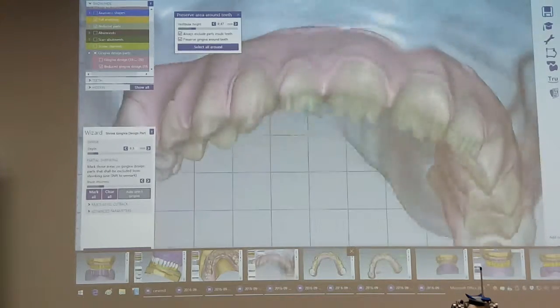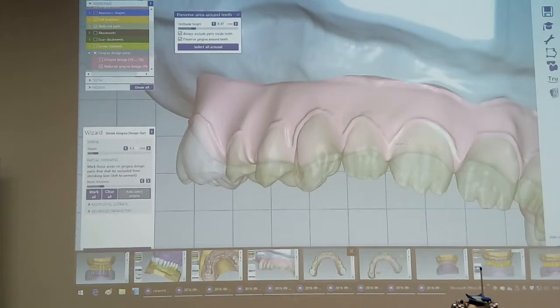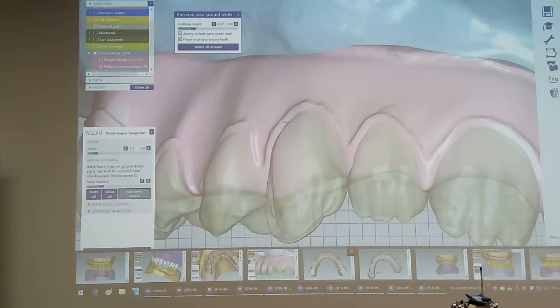Now I get this from the front view. There is always around the neck of the tooth the safety zone in zirconium. After the milling procedure, you will use a handpiece and you will smoothen a little bit, but then you can protect the tooth neck with the help of this borderline against radiations or against abrasions.